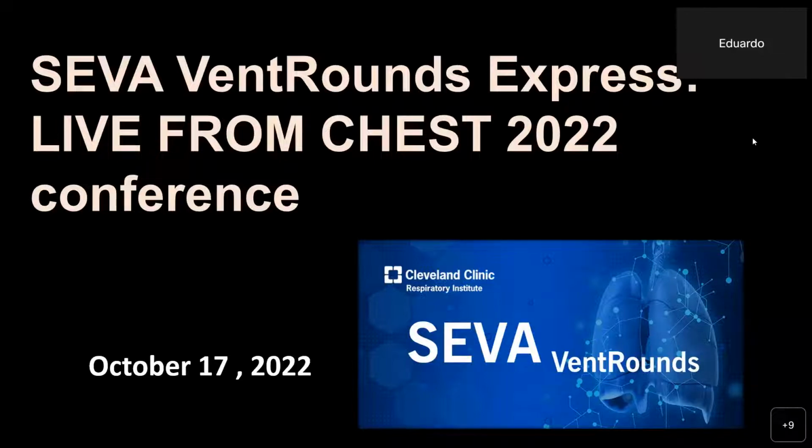This is SEVA VentRounds Express, and we're going to do it live from CHEST 2022 conference. Today is October 17, 2022. And we have a couple of images. Well, actually, the three images come from Twitter, and we're going to analyze all of the waveforms as we speak.